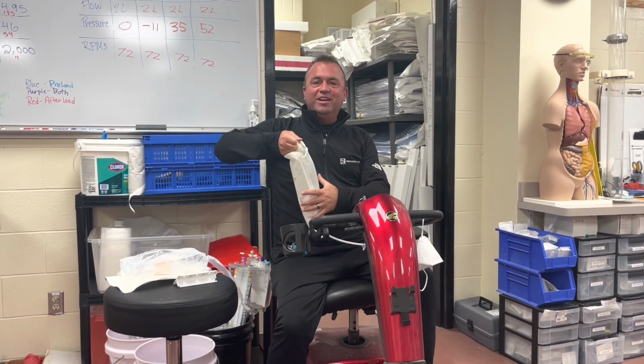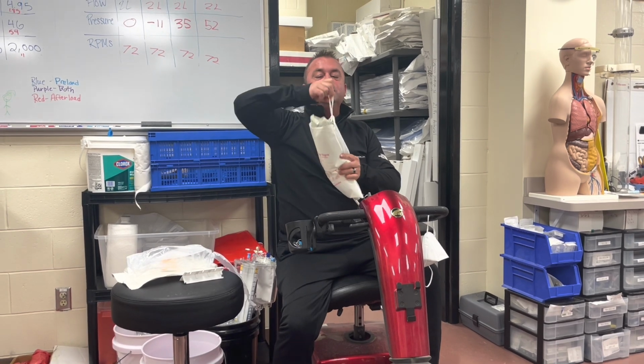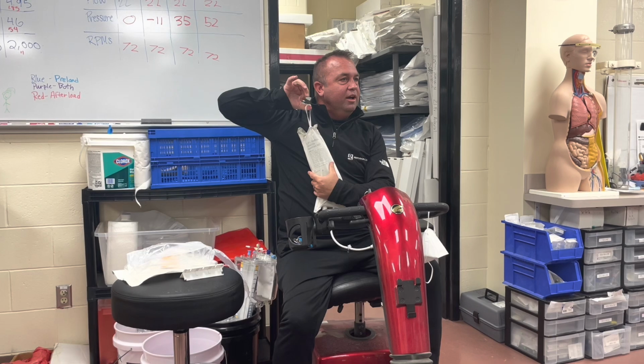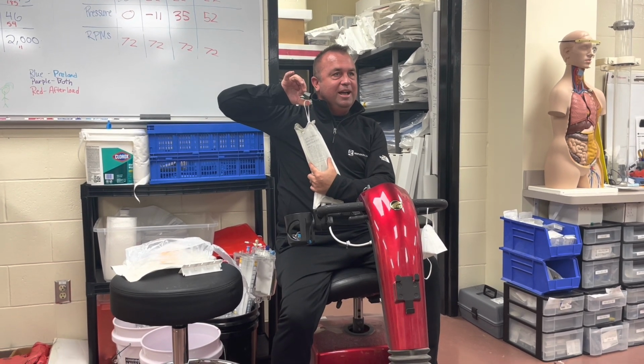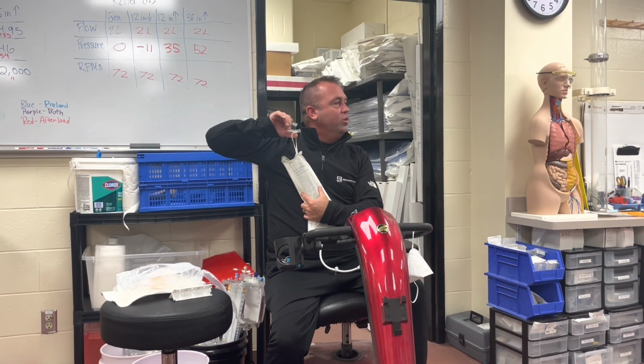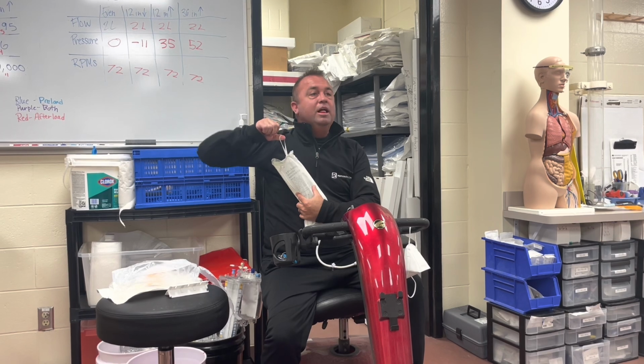So what I'm saying here is we have the opening for the bag and we have this loop. Some people will just hang this and then blow it up. What do you think is going to happen a lot? This is going to lose pressure, and what's going to happen? It's going to fall out. Well, how happy is the surgeon once that falls on the floor or bangs into an instrument tray or something like that, and really upset?